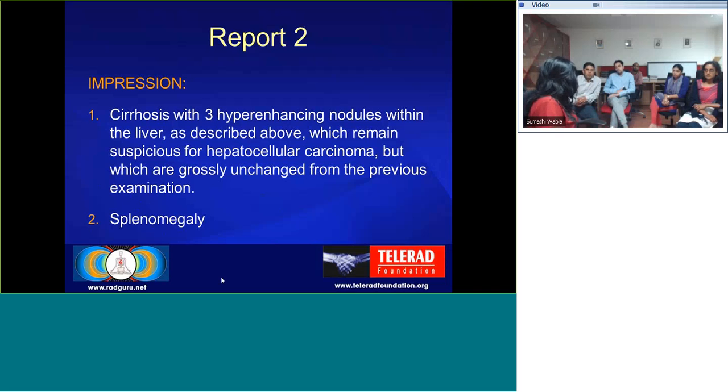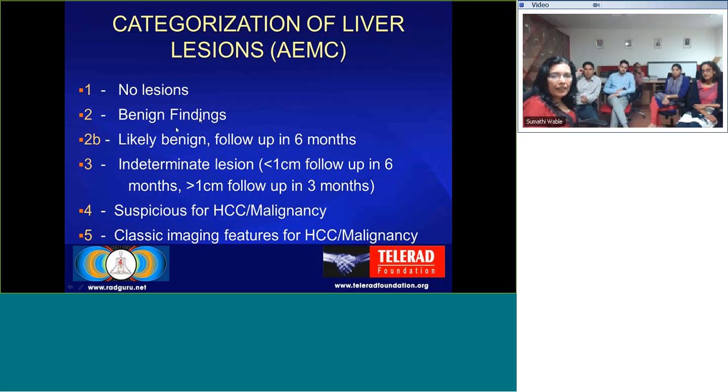So you should not call every focus that we see on the arterial phase HCC. You should also take other things into consideration. So that's how our report was, and then eventually we evolved into this.